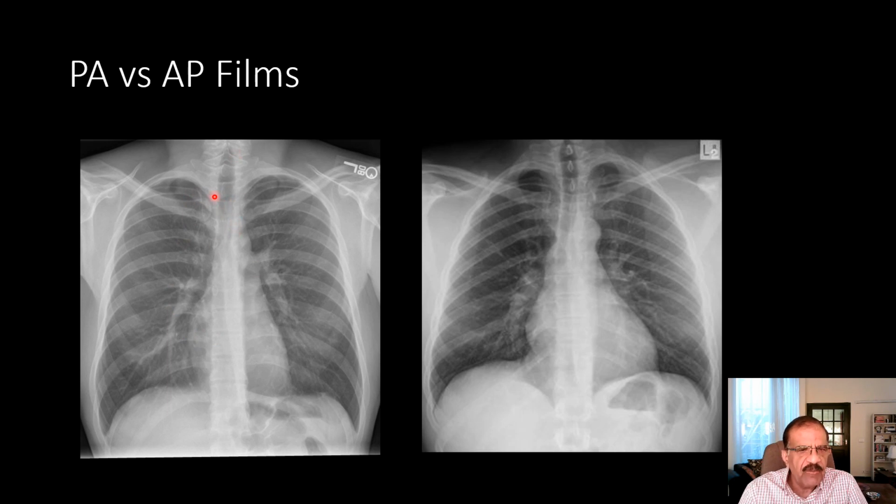So this done, now you identify the ribs. First of all, you have to identify the first rib. Now this one, of course, is the first rib. How do we know this is the first one? Because this is first in the line from above. This is the first rib, and this is the posterior end.